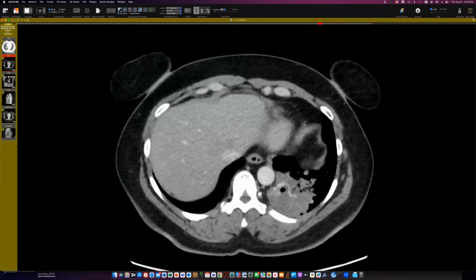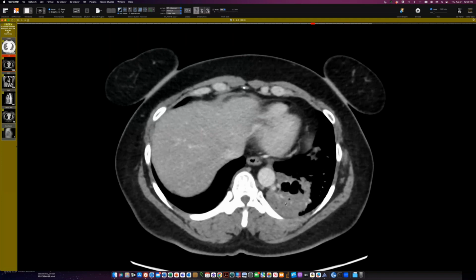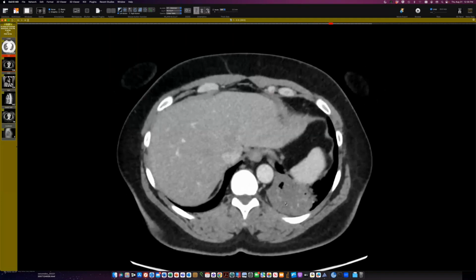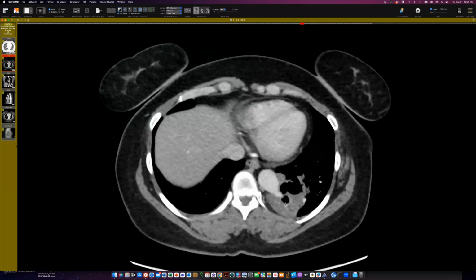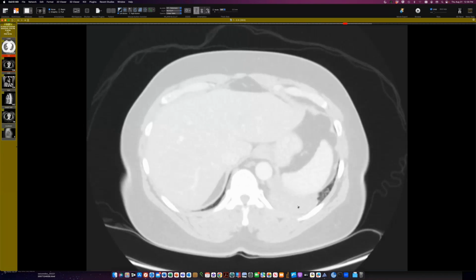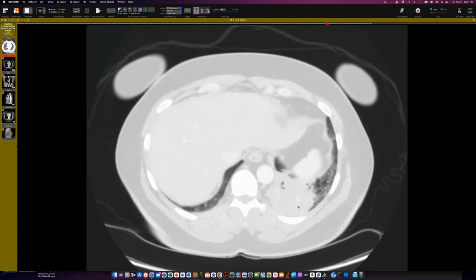And so once things cooled off, this lesion has been resected, but only with contrast here and picking up the congenitally placed artery can we identify this as sequestration. So if they'd given contrast at the beginning, they could have cut out a whole big workup, including needle biopsies and a PET CT scan. Yeah, really.